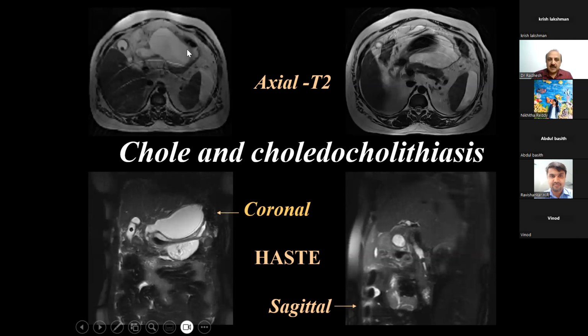The patient is supine and this calculus gravitates below into the dependent position. Suppose you saw this black area above, in the non-dependent area, so you know it can be calculus or it can also be air. The dependency is usually by the calculus, while the non-dependent area is for the air.